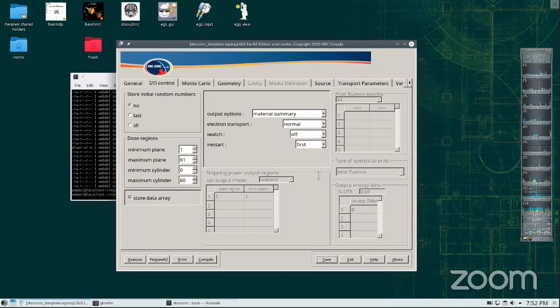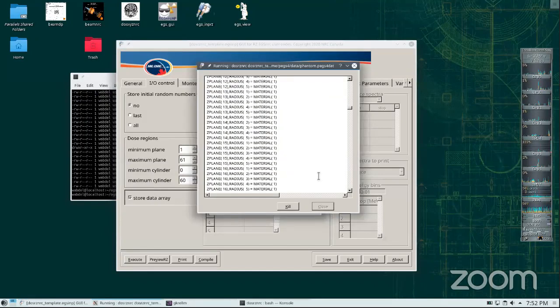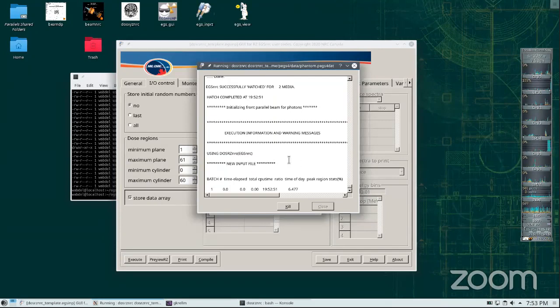So I'm just going to wait for some time while this is calculating. Any other questions? If you have questions, just raise your hand. Maybe 1 minute is too much. It's going to take a long time, so I'm going to kill this. Let's reduce it.